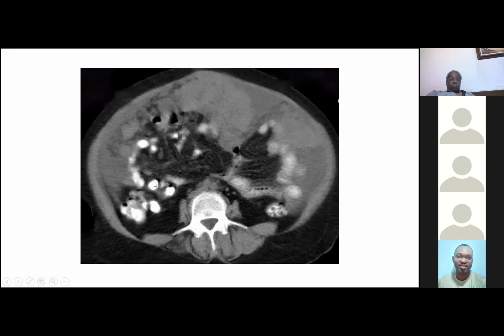The one advantage of using the oral contrast was that you could actually see where the bowel was very easily. In this case, you can see that these areas here where my arrow is correspond to bowel, but there's extra soft tissue here anteriorly, in the anterior aspect of the abdomen. Can anyone tell me what you think this is?